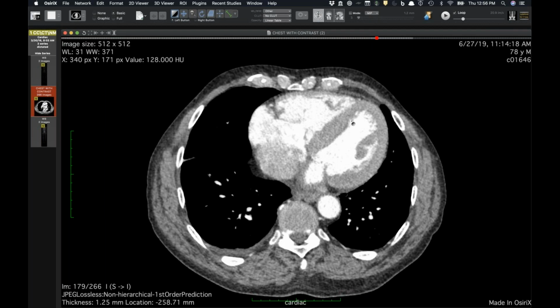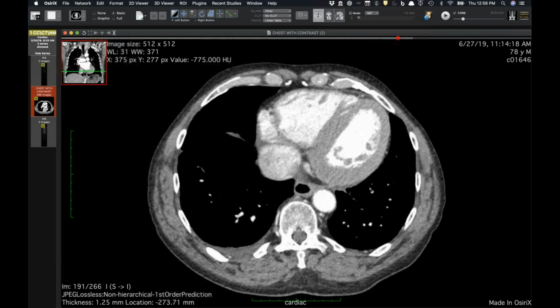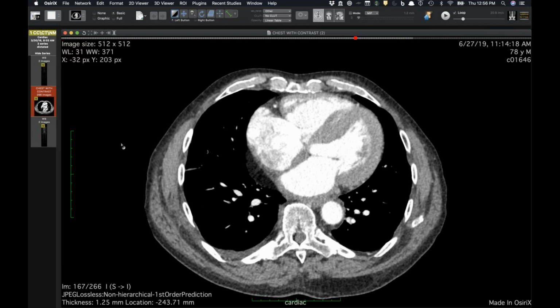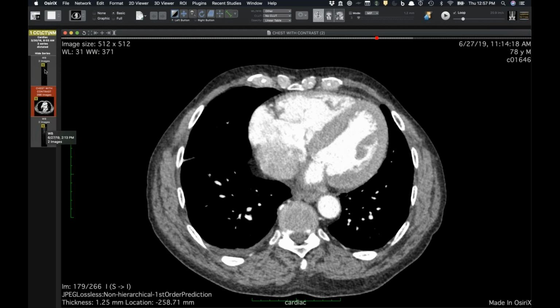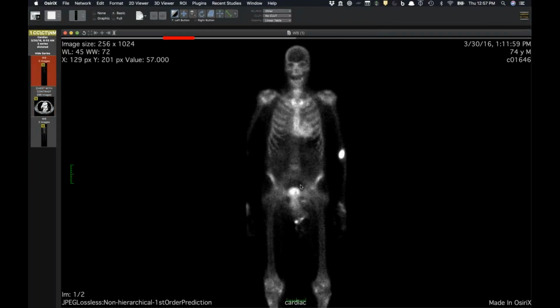And I think we often see this occasionally. I'm not going to diagnose it based on the CT, but there's a little bit of decreased enhancement of the subendocardium from that. It's been a long time since I've thought about bone scans, but you can see it with cardiac uptake, specifically transthyretin. And knowing that diagnosis, you can almost make the fact that there's thickening of the atrial walls as well. But who knows? We see that all the time. But I didn't realize that it was hot on bone scan. That's actually really cool. I had no clue.